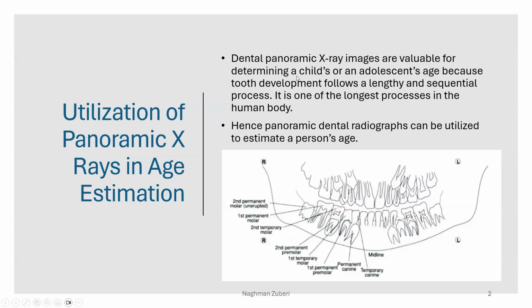Dental panoramic X-ray images are valuable for determining a child's or an adolescent's age because tooth development follows a lengthy and sequential process. It is one of the longest processes in the human body. Hence, panoramic dental radiographs can be utilized to estimate a person's age.